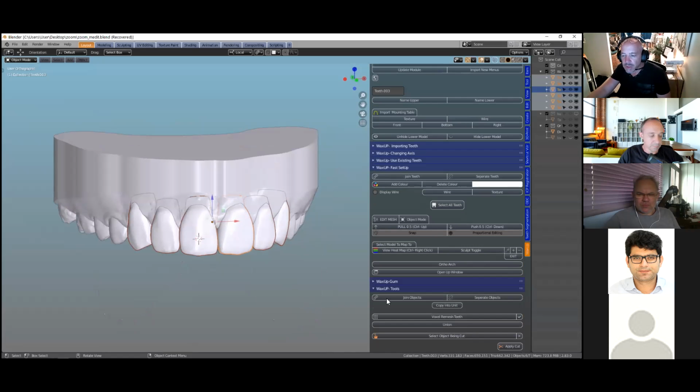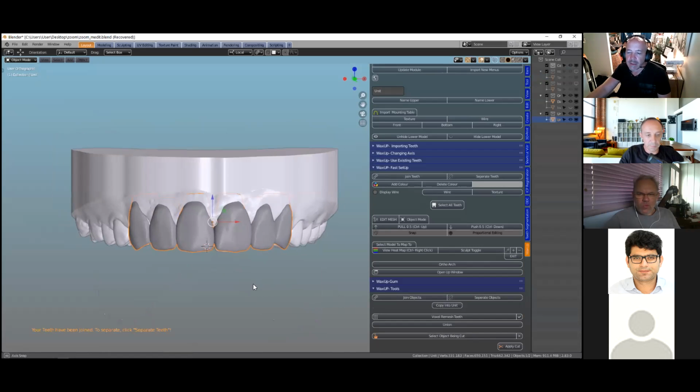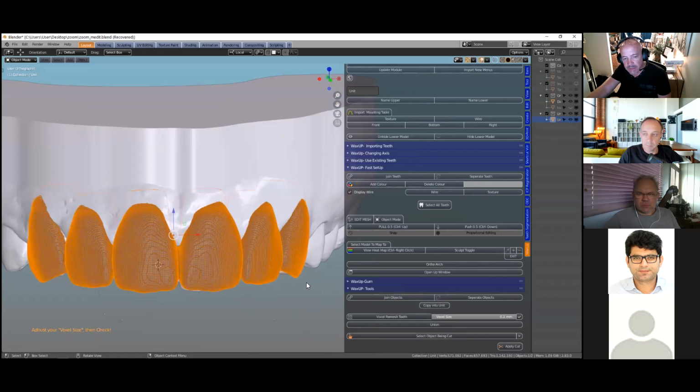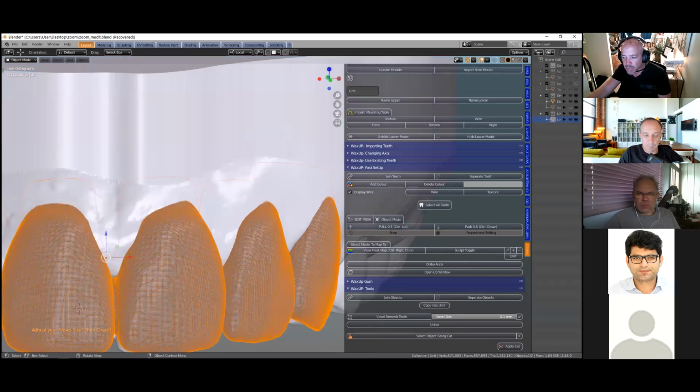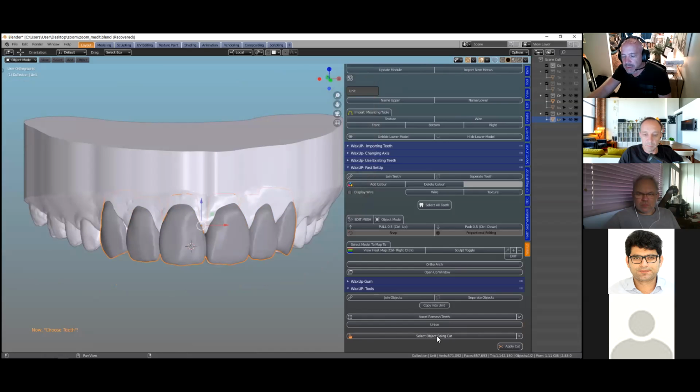So what we'll do is we're going to join these objects and copy into a unit. And so this now gives me the opportunity to voxel remesh it. And again, like the other modules, we can set the voxel remesh. And then what I want to do is I want to cut this. So select object being cut, and I'm going to choose this one.